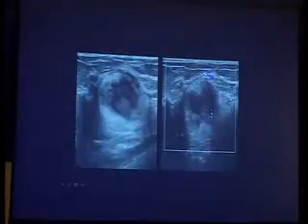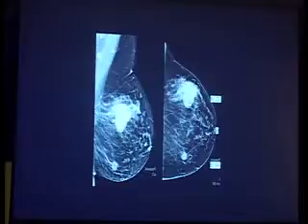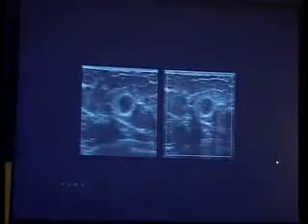Now, if I show you these alone, you can say, could that be an abscess? Yes, it very much could have been. The mammogram doesn't look like it so much, because she doesn't have any inflammation of the skin or anything else, but most importantly, she didn't present that way clinically. Okay? So even though these images very well could be an abscess, she did not present that way clinically. Here is her second, smaller mass, looking very analogous to the bigger palpable lump.